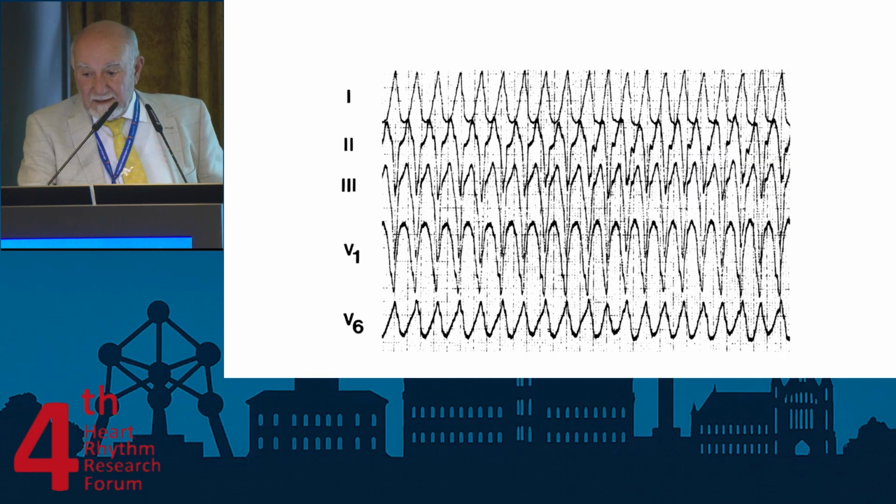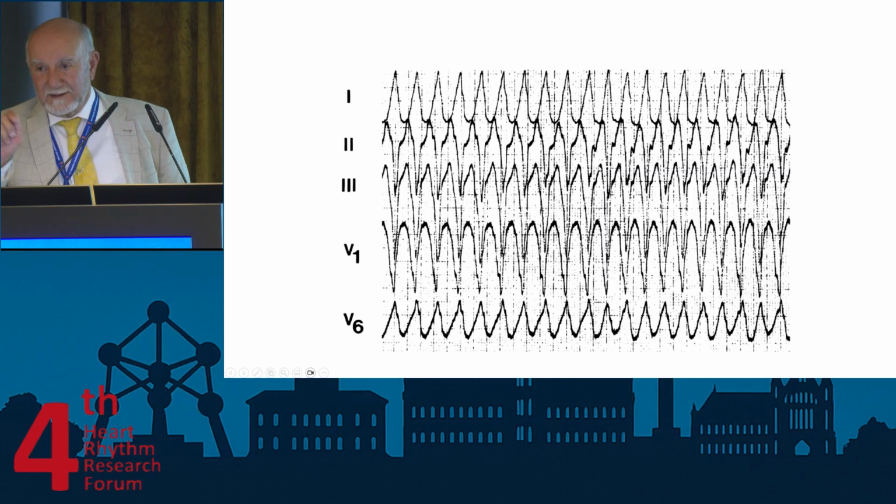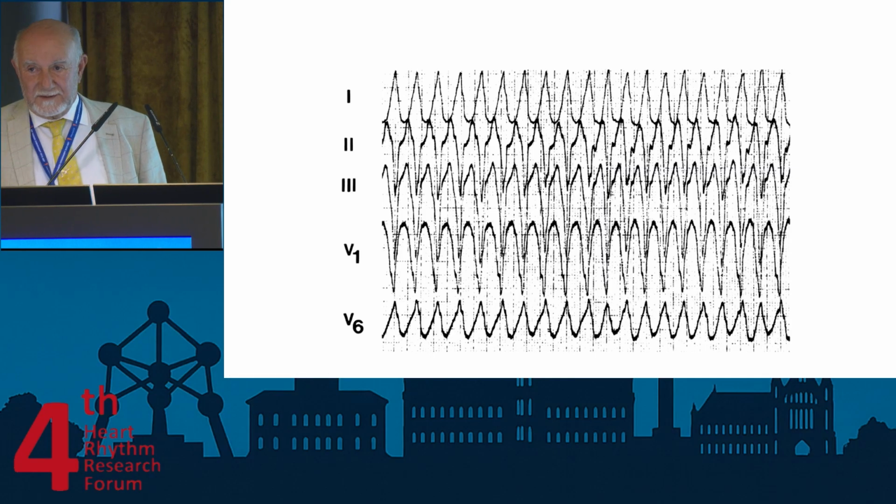If you look carefully, you see that when this appears, the tachycardia accelerates. So you see this notching, and then the tachycardia becomes faster.